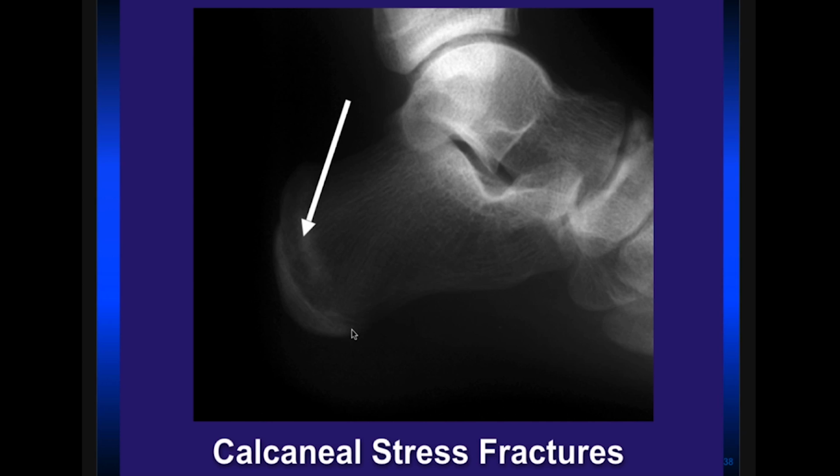This is his lateral view. This is his almost closed calcaneal apophysis here. And you can see the trabecula of the calcaneus. But then when you look here, this is a healing stress fracture. So a lateral view is very important to obtain if patients have continued heel pain.